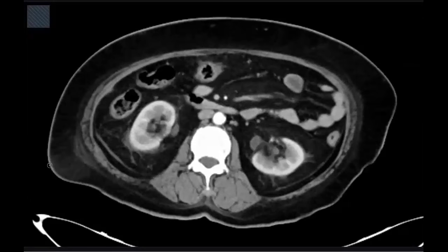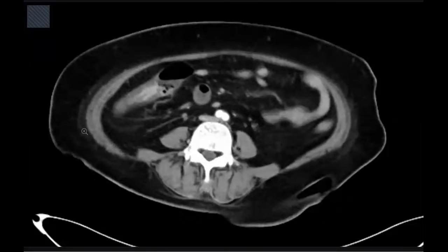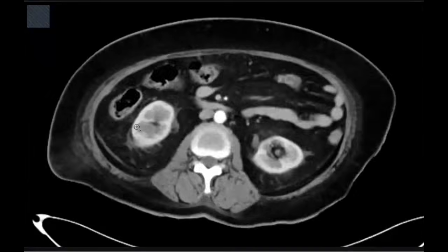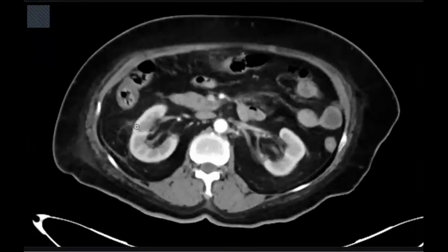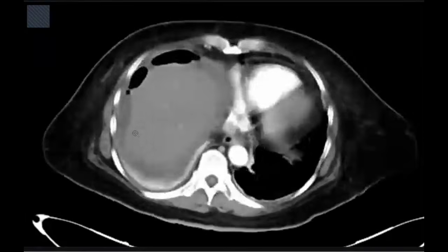What could be the possible causes for this case? This could be due to a pyogenic abscess, or it could be amoebic. Inflammatory markers and any history of travel would help in that case. I would also like to see the bowel to look for any element of colitis. What do you think is the causative organism for this abscess? I think it appears to be more of an amoebic type of abscess, as it has mottled lucencies.